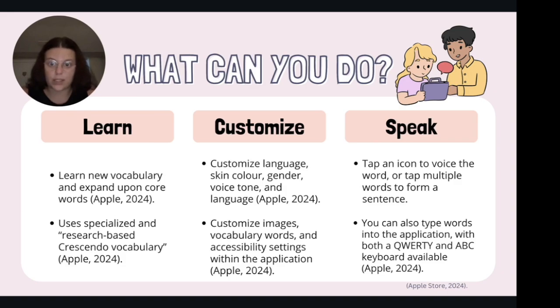Mostly, this application is a speech tool. Users can tap an icon to voice the word or tap multiple words to form a sentence. Users can also type words into the application with both a QWERTY and ABC keyboard available.